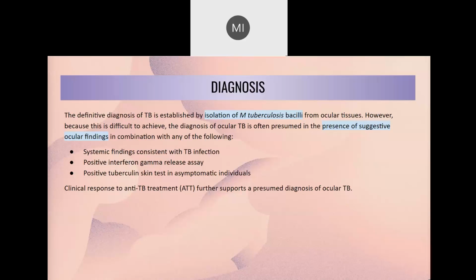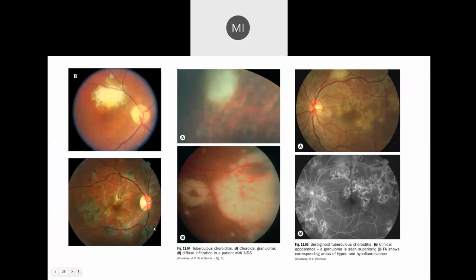So, the diagnosis of ocular TB. Sorry, doctor. Go back to the previous slide. Okay, good. This is a good image of all the posterior fundus findings in TB.